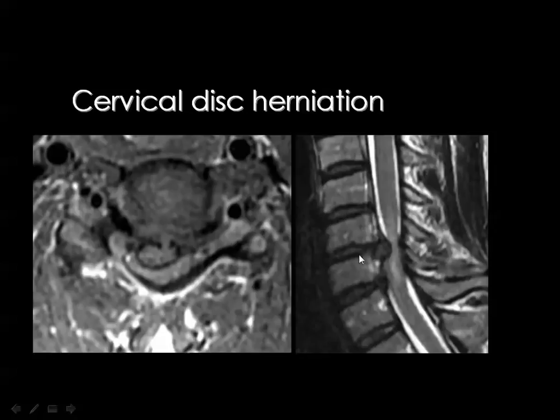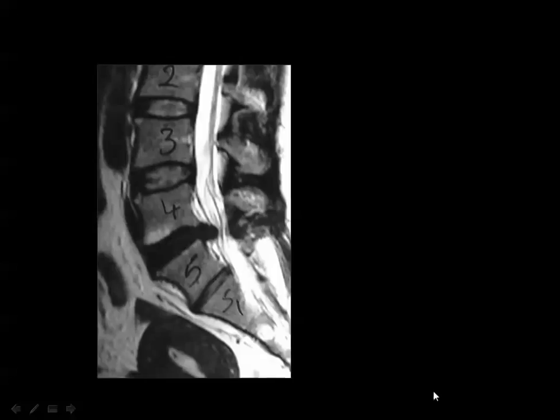If you look here in this cervical spine, you see there is a disc which is extending inside the spinal canal. The disc is exceeding the vertebral end plate of the vertebra below. Then by definition, this disc should be herniation. And if you go here and you see that this disc is focal and it is more to the right side, and it has a very narrow base and a height which is more than the base, denoting that this is actual disc herniation.